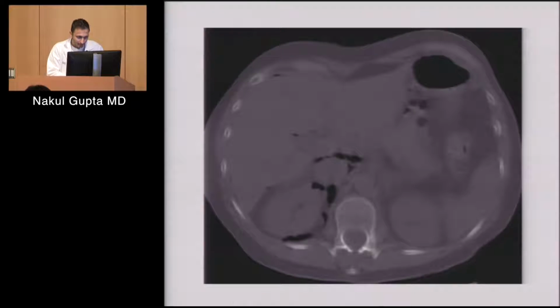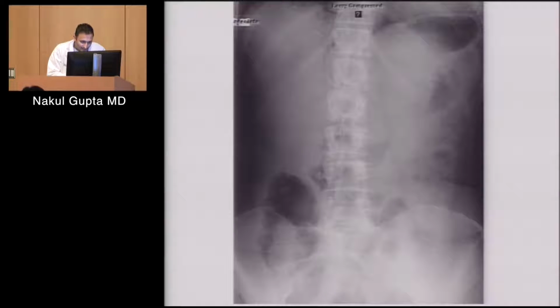Let me see what we're showing here. Okay, this is a subtle case. Okay, so I'll let you look at this KUB for a second here.